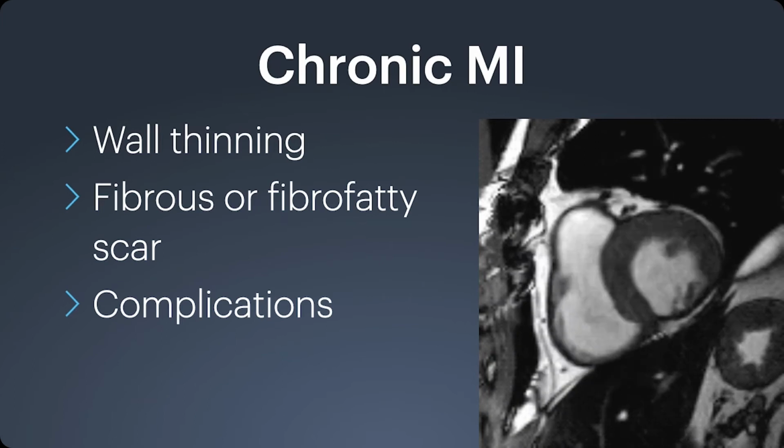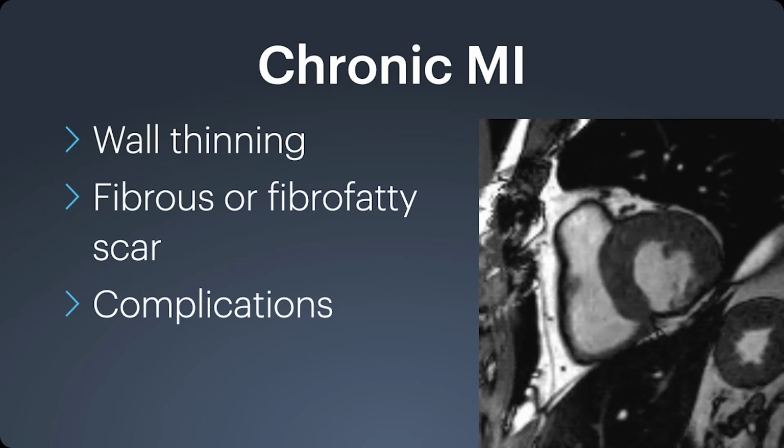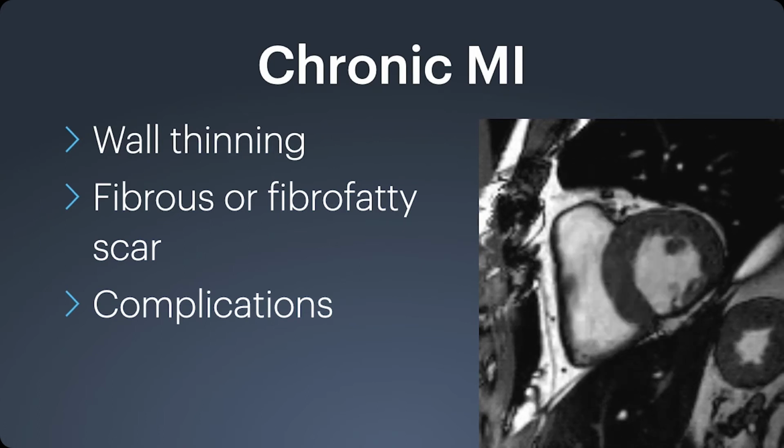What about chronic myocardial infarction? Well, the primary imaging features there, in addition to delayed enhancement, are we see wall thinning, as demonstrated in this case. The inferior wall is almost completely just gone. It's a thin, fibrous band. It's not moving, so we have wall abnormality, motion abnormality as well.